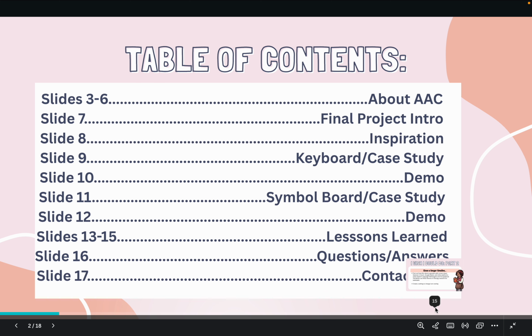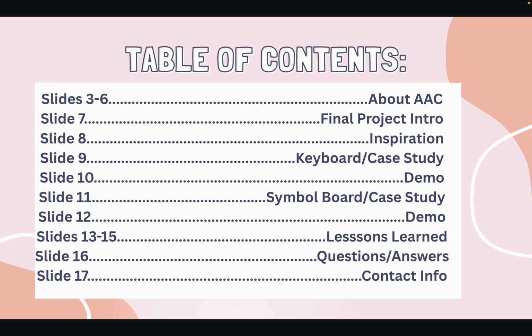In this presentation, you will learn more about AAC, otherwise known as Augmentative and Alternative Communication. You will have an introduction to my final project, learn about the inspiration behind the final project. You will have a demo of the keyboard, the symbol board, and some other features. You will hear about the lessons learned, have the ability to contact me with questions, and I can respond to those questions via email or just leave me some comments about what you see in this presentation.